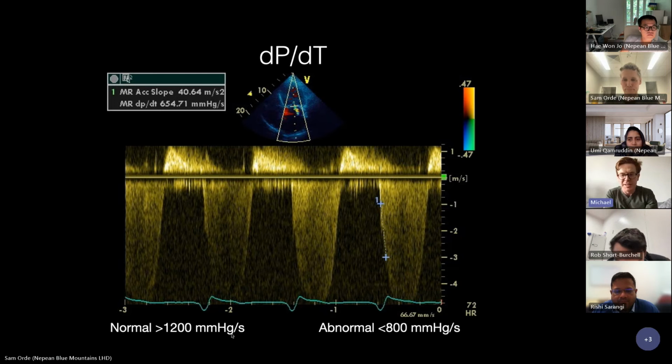Yeah, so it's the rate of change of the flow of the mitral regurgitant jet. With a faster rate of change, meaning better LV systolic function, measured between 1 and 3 meters per second. You've got normal values there, like you said. This image. Why 1 to 3? What's the maths behind that? Why does that work? There's something about the maths that makes that easier.